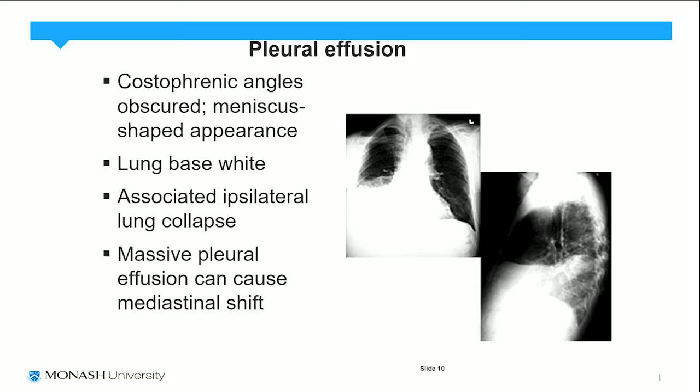So it's clear with this case that there is a large right pleural effusion, and on the lateral view we can see that it affects the right lower lobe as well as the middle lobe.